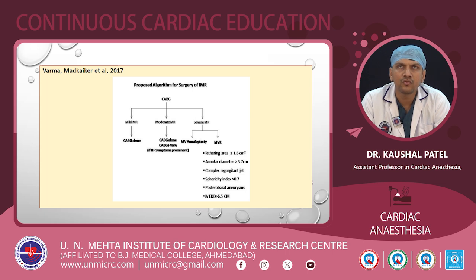And if the patient has severe MR, we look at different parameters like tenting area, annular diameter, tenting height, sphericity index, interpapillary muscle distance, and LV end diastolic and systolic diameters. If they are favorable for mitral valve ring annuloplasty, then we do the annuloplasty.